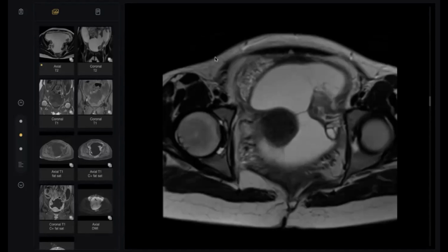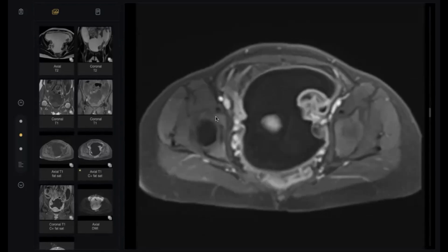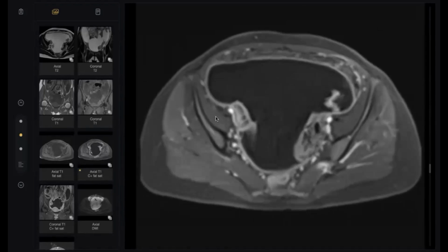It was a case of tuberculous peritonitis. As you see here, very nice description, really. I am so impressed. Look here, my colleagues.